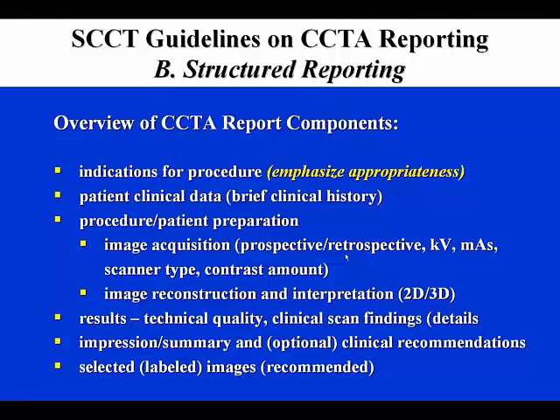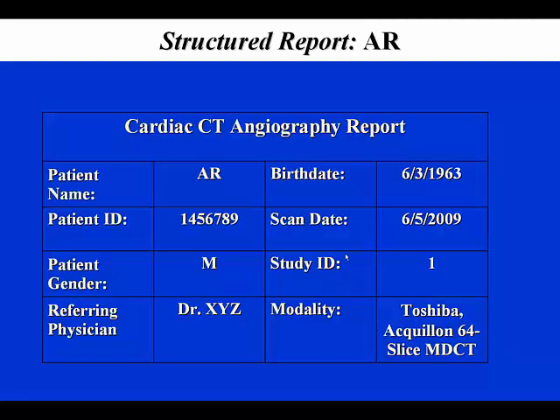This particular individual, AR, that we are examining, this is the demonstration that you would put in the report with respect to the patient name, birth date, scan date, and other important characteristics, including the imaging modality employed. This is a review of the overall impression in this particular patient.